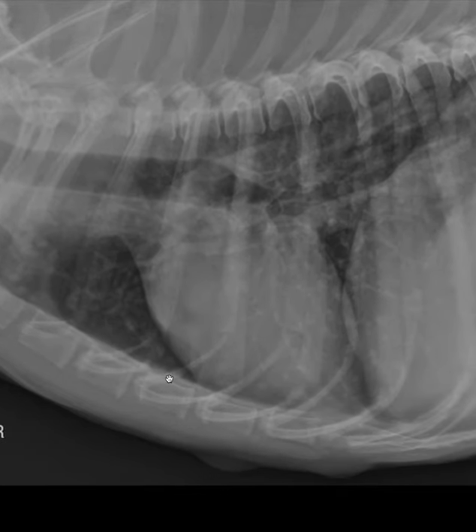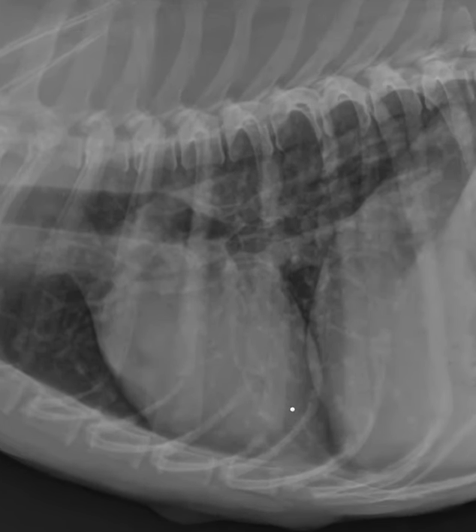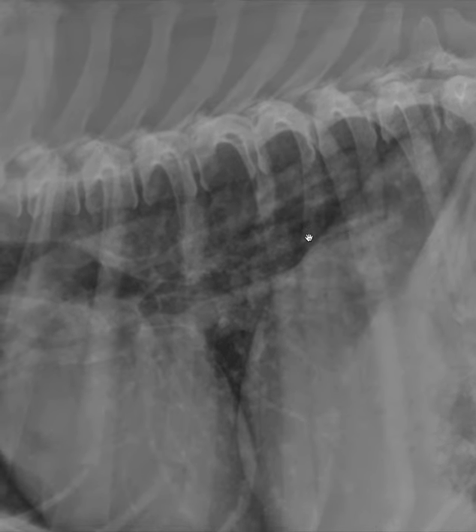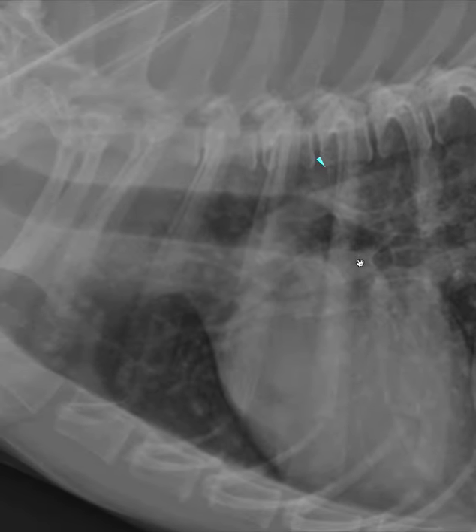So last week we talked about when we're looking for nodules, we're going to get in really close, and I really like to look at every lung field on every view individually, giving its own time. And once I start finding things that I'm getting suspicious are looking round and nodular, I'm going to start flagging them here. They're all over the place here, okay? I really start to put together in my mind some thoughts about what could be causing pulmonary nodules.